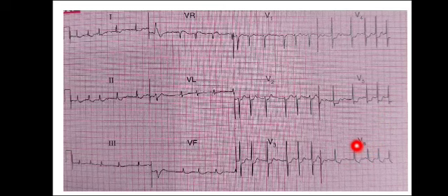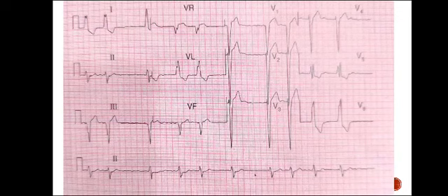इसका एक limb, this is asymmetrical T wave inversion, in which one limb is greater than the other limb. So ये जब भी आपके पास आता है तो या तो ये strain pattern होता है या फिर ये digoxin effect होता है. ठीक है, तो atrial fibrillation के साथ अगर आपको इस तरह का पैटर्न मिल जाए तो most probably this is digoxin effect. तो इस ECG की अगर हम interpretation करें तो this is atrial fibrillation with probable ischemia and digoxin effect.